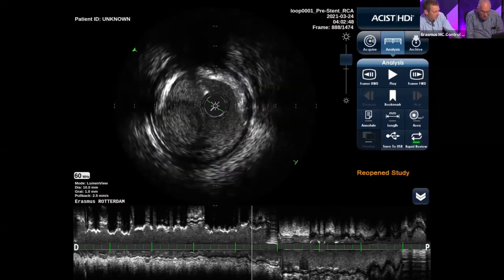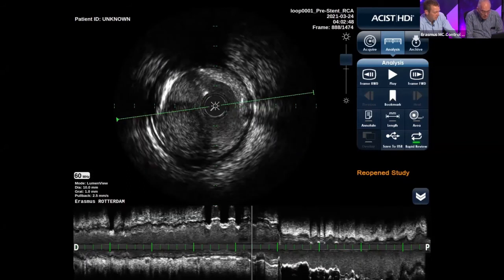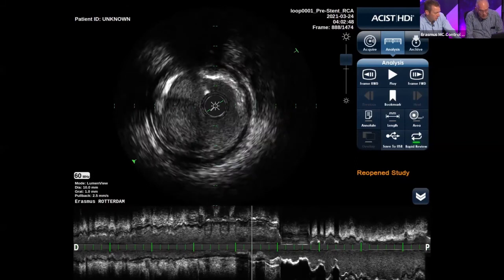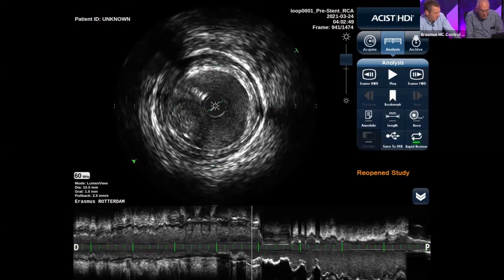I think. See, also here at 8 o'clock, 6 o'clock, you see this thrombus in this vessel. Here it's getting even more. Yeah. See, but this is a beautiful example, a huge mass. Even perhaps starting to become a bit organized. I will see if I can rotate the cutting lines a bit so we can appreciate it more on the longitudinal view. You can see it here on top. There's a thrombus and it continues all the way in here.